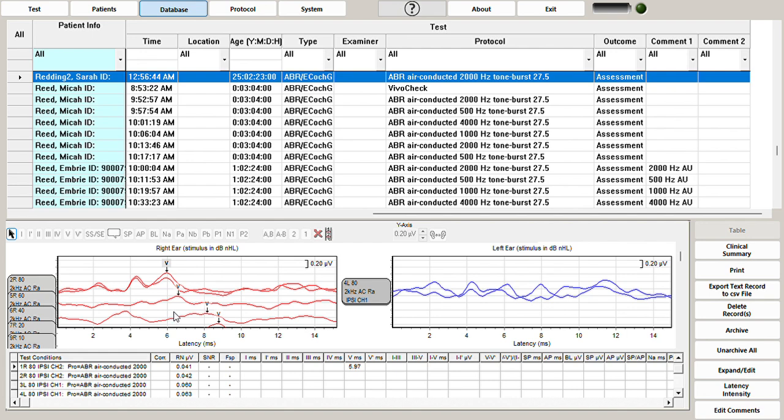So I had labeled wave 5, wave 5. So I'm just going to keep scrolling down, make sure I've got all the wave 5s that I wanted to label here. Okay, so wave 5 is labeled in every place. Again, make sure you're duplicating these. I only ran 1 just for the sake of time and for the video, but you want to make sure you're running 2. So let's place some more statistical start and end values.